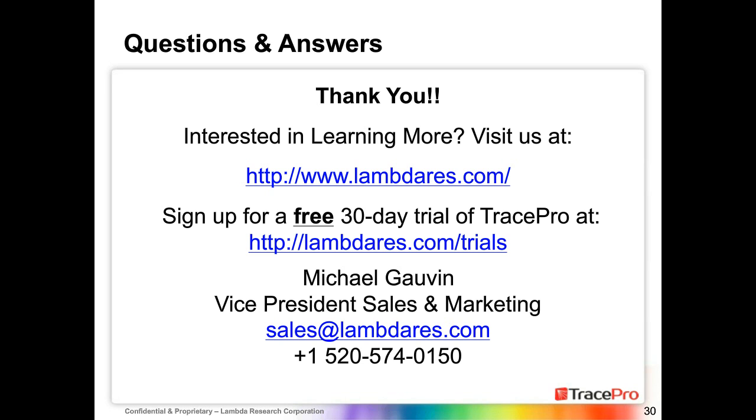How does your RayViz product help do virtual simulation of pulse oximeters? I'm glad that was asked. Pretty much, RayViz allows you to do ray visualization. So all the things that you just saw in terms of being able to see where light's going in the sensor and through a particular object can be done using the RayViz product. It just shows you rays being traced through it.